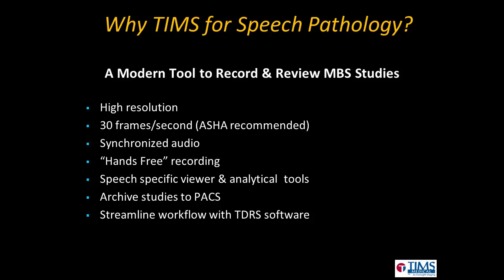After the studies are recorded, they can be sent directly to your hospital PACS system where they're safely backed up and encrypted. Each TIMS system includes a copy of our TIMS DICOM review software, which can be installed on a workstation, typically in the speech office, which streamlines the workflow significantly. We'll cover that more in a moment.